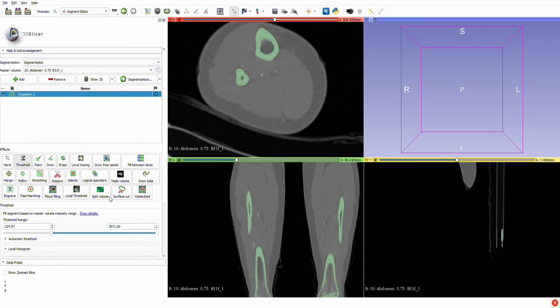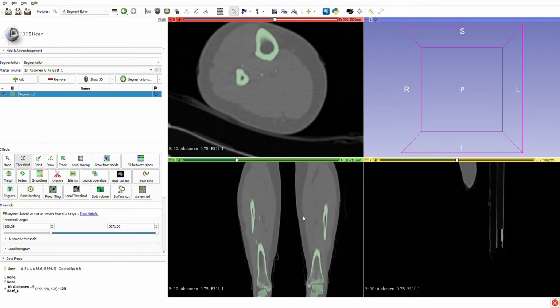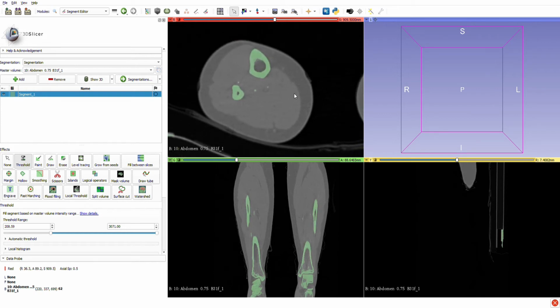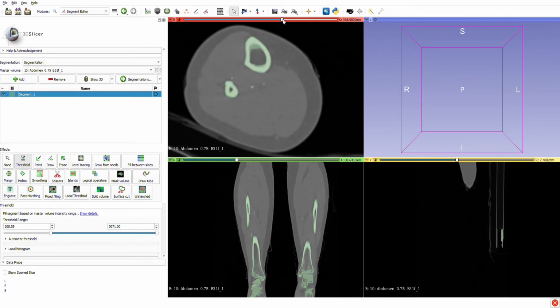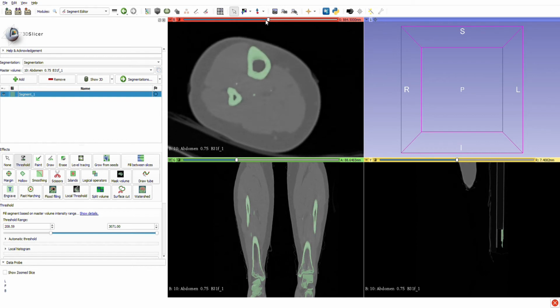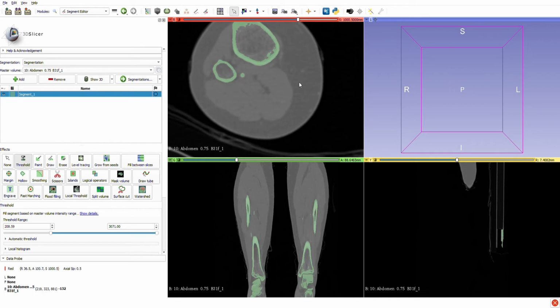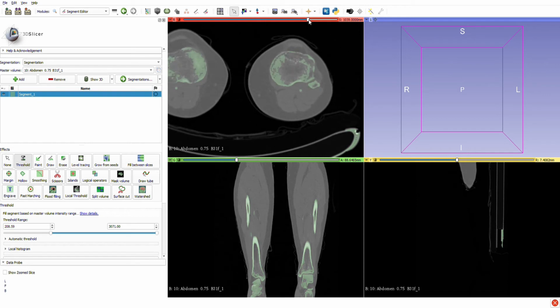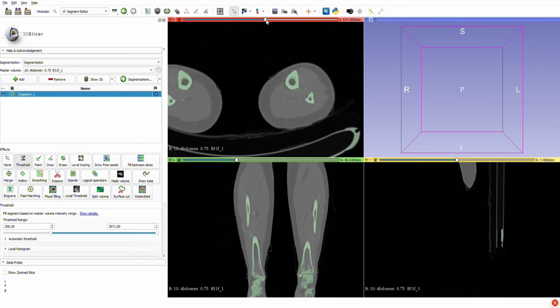So let's start with the segmentation. Usually when surgeons, my colleagues, perform the reconstruction, they prefer to use the right fibula, but sometimes the anatomy has variations, or there is atherosclerotic disease of the lower arteries, so we have to choose the left leg and the left fibula and peroneal artery.